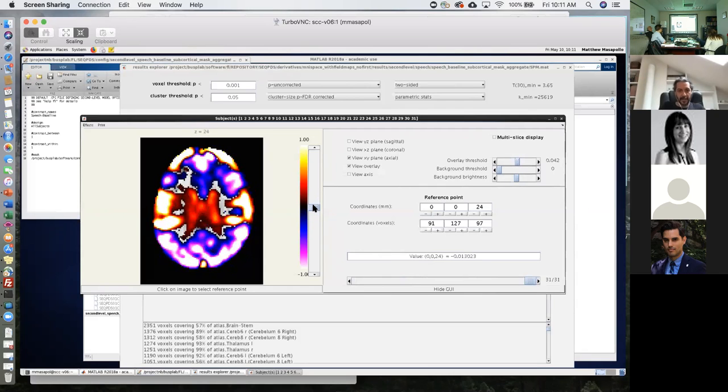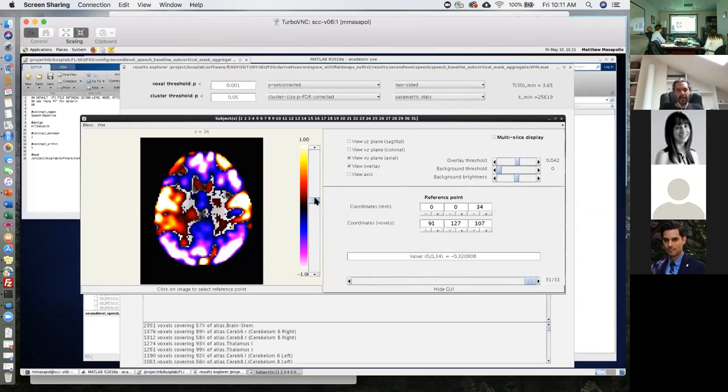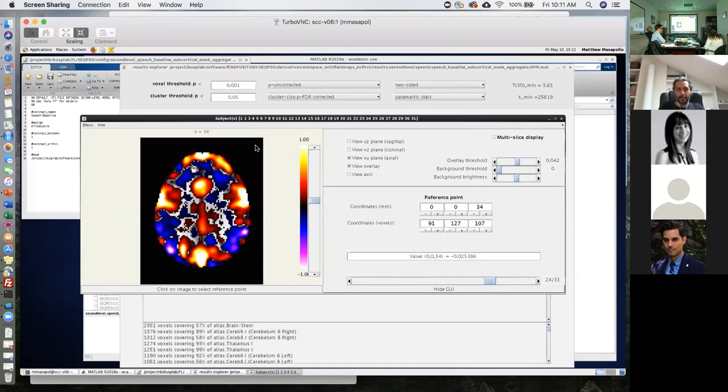Yeah, I'm not seeing it either. I could find it in the original masks, but I cannot find it in here just by visual browsing for it. So I don't know. Perhaps it's simpler to look at the anatomy and see how can we look at that in a simple manner. Because by default, it's not going to show us the anatomy very well.